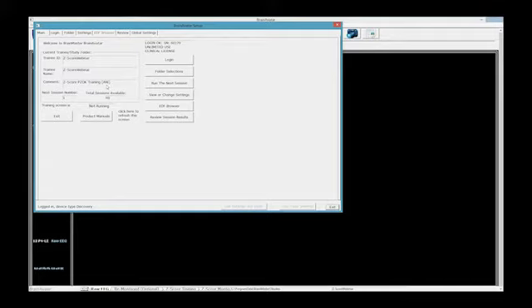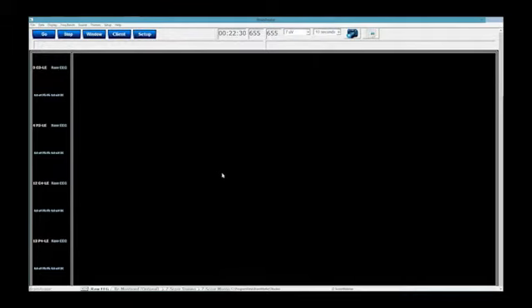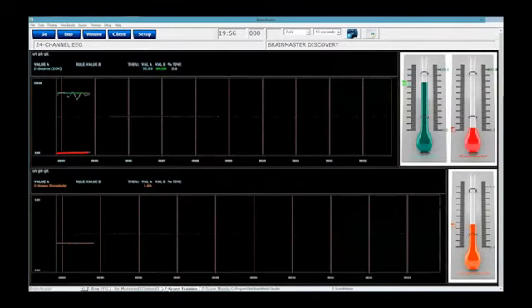Now, you may also be asking yourself, what's the difference between PZOK and PZOK-UL? Well, in order to really answer that one, let's take a look at this protocol right here and look at the training screen so that we can see exactly what the differences are between those two protocols. There is not that much of a difference. So here we go. We're going to get our session started. We got our simulation. Now let's go to the ZScore PZOK training screen.